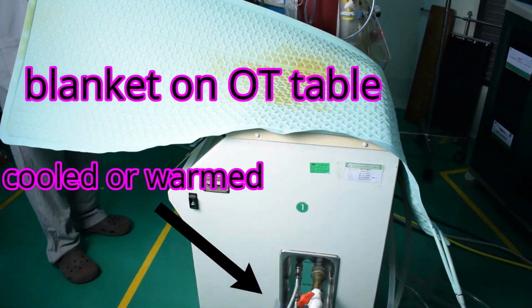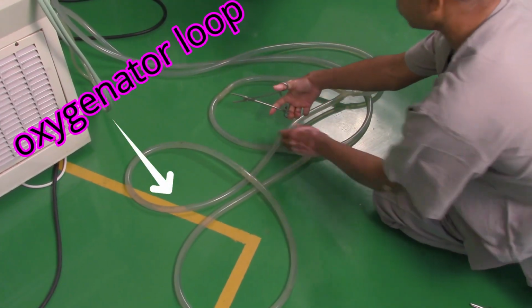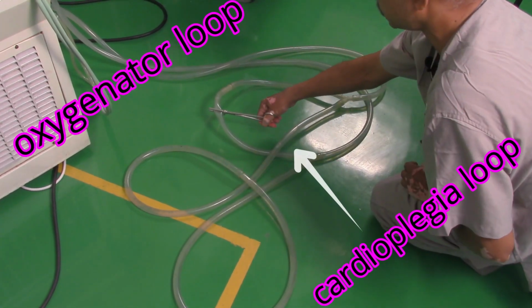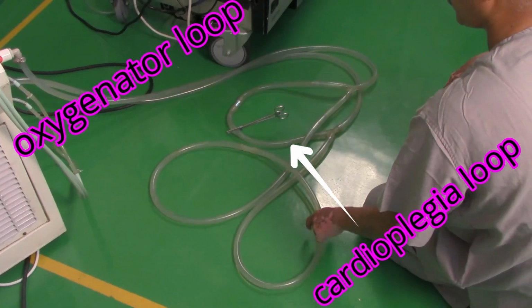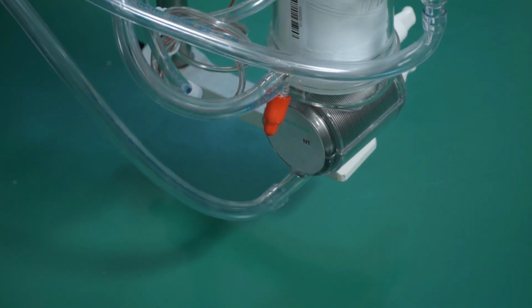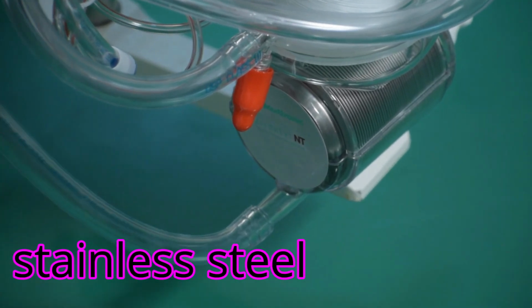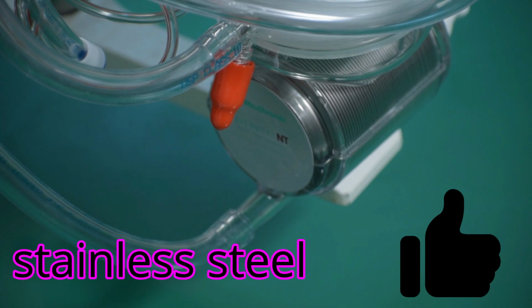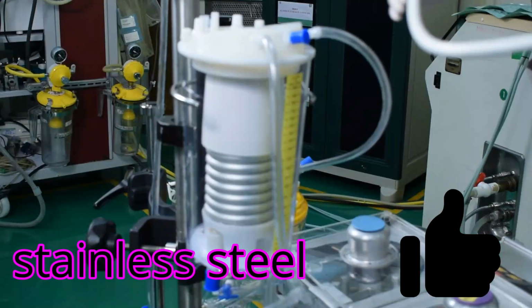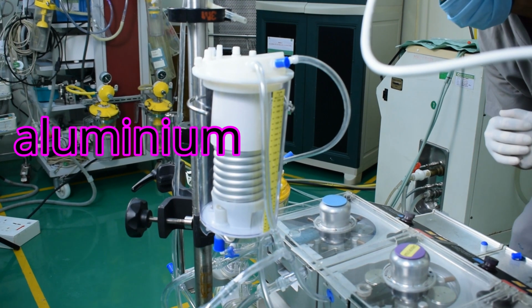Now, water as a heat transfer fluid is simple and reliable and provides an even temperature distribution across the surface of the heat exchanger without localized hot spots. Now, the heat transfer surface is usually made of stainless steel or aluminium, with stainless steel being more durable and chemically inert of all the commercially available heat exchangers, but is expensive.